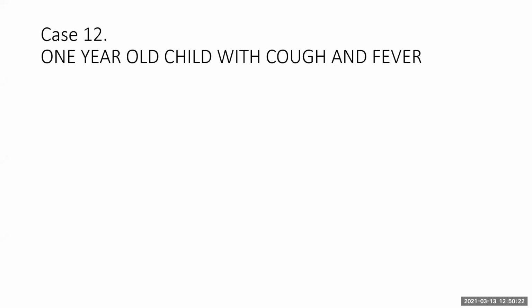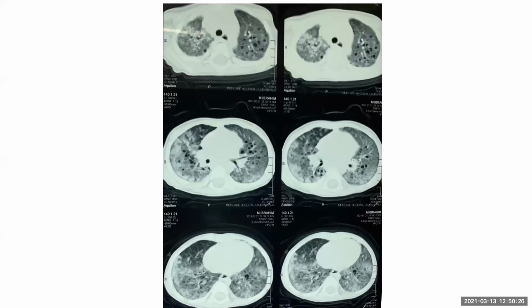Next case is a 1-year-old child with cough and fever. Okay. So I'm looking at the CT thorax lung window of a 1-year-old child who presented with cough and shortness of breath.